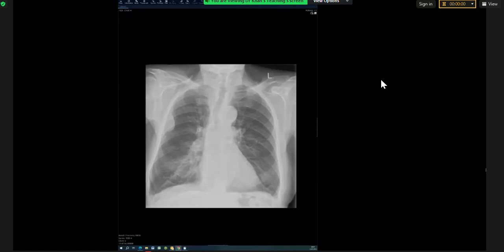For the sarcoidosis case, silicosis in coal workers can also cause lymph node calcification. Was it the posterior predominance that made sarcoidosis more likely? Yes, absolutely. It was a typical appearance. In coal workers, pneumoconiosis, you tend to get lung calcification as well. The nodules you get in pulmonary sarcoidosis don't tend to calcify, whereas in coal workers, you tend to get lung nodule calcification as well. And the lung is a bit more rough looking, dirty looking, scarred looking.